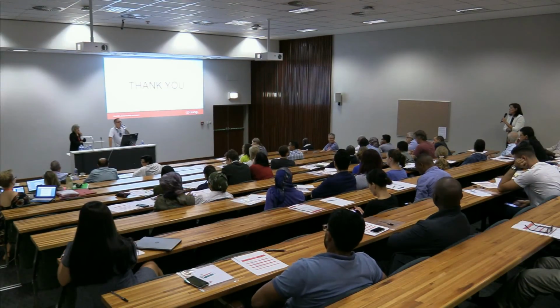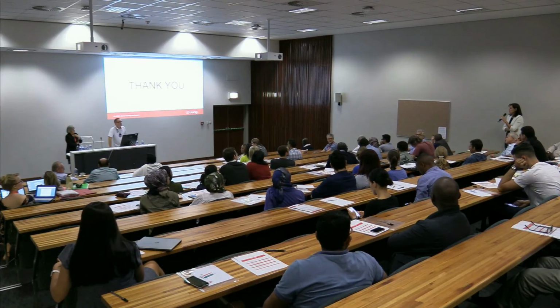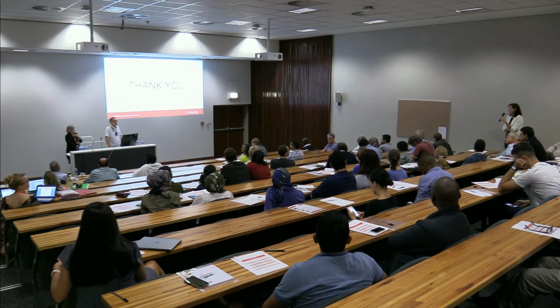I'll ask a question, Douglas. Can you comment on the features in pelvic inflammatory disease, which of course in our communities is quite common? In terms of adnexal appearance.